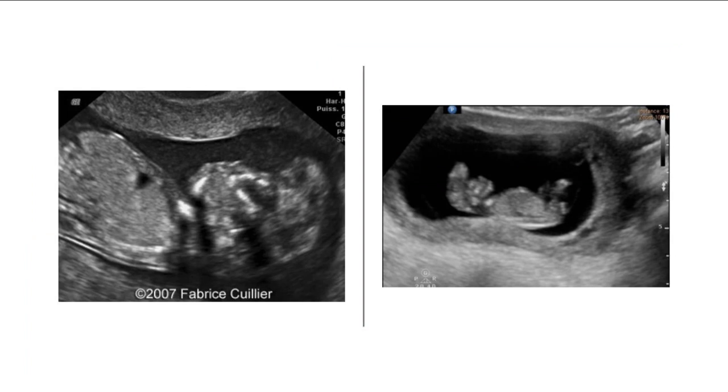So here we have two pictures of the crania. Of course, the image on the left-hand side is going to be a little bit further of a gestational age. Picture on the right-hand side, pretty early gestation. You can see that we almost have sort of like this horn that's coming off in both of these babies, and that's because they have brain matter, they have brain parenchyma, but they don't have any of the cranial bones to contain it. So it's kind of like this free floating brain tissue.